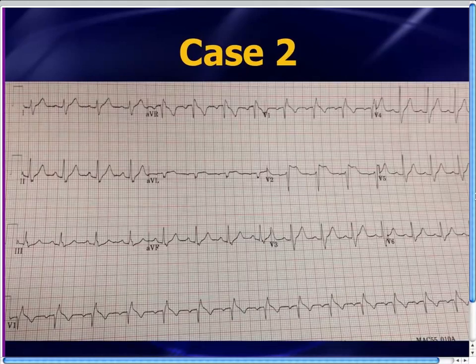Anyway, there's the 12-lead EKG, and once again, your description could very simply be that this is another case of ugliness. Anyway, this is another ugly-looking EKG. You see that there's an incomplete right bundle branch block pattern in V1, and there's ST segment elevation in V1 and V2, and that description should be sending alarm bells off in your head, light bulbs going off, whatever else should be going off in your head.